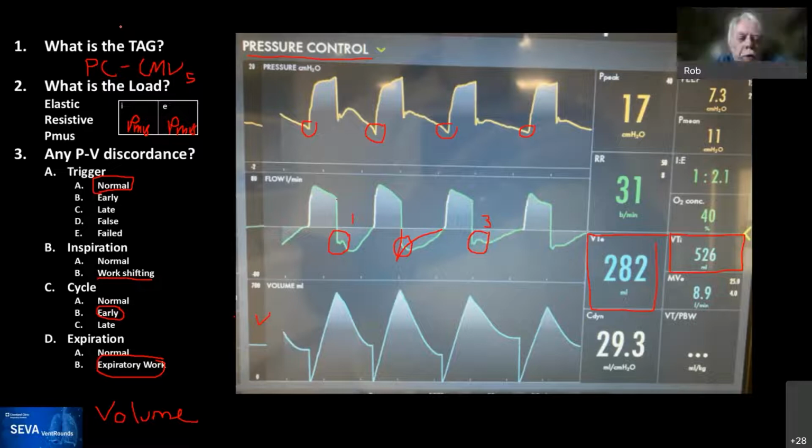Well, the first thing is you have to determine, is this really a leak? It has the square root sign like a leak, but there is something else that's weird about it. What's weird to my eyes is that the exhaled tidal volume is always less than the inhaled, but it's radically different from breath to breath. What would cause such a variable leak for the same inspiratory pressure? That seems kind of odd. What if it's not a leak? What if it's just the patient not exhaling all the way because he's breathing like a freight train here, in and out?